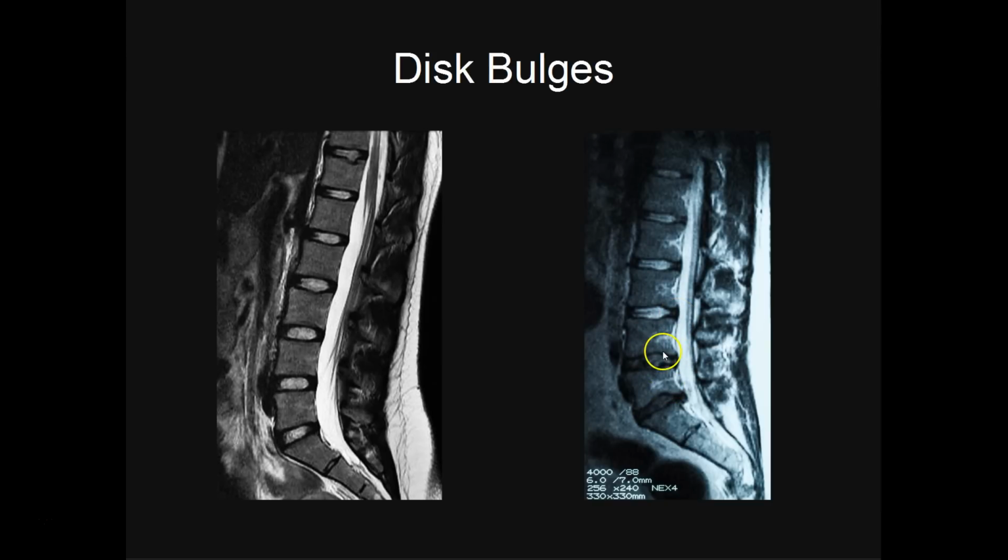So you can see this back here, compared to this one, these discs are a lot more damaged, and what a lot of practitioners would call this, in a general sense, is degenerative disc disease. But in actual fact, if we look at the disc, look at the damage that's occurring to it, and also the direction in which the bulges and the herniations are coming out, that gives us a big clue as to why this back is in trouble compared to a healthier back. So if we look here, each of these two discs, you can see the bulge is coming out this way.